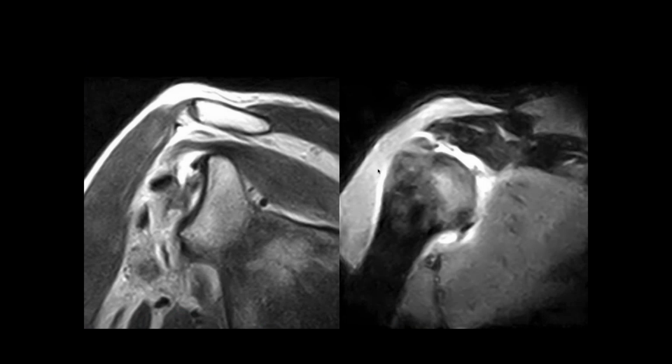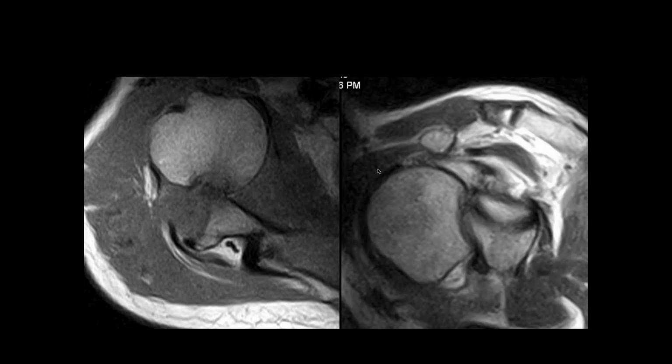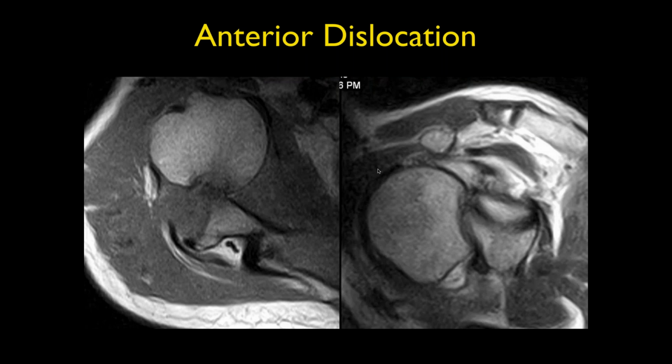On the image on the left, I don't see the humeral head. On the image on the right, I guess we moved anteriorly, and then we do see the humeral head, so it's anteriorly dislocated. Okay. And yeah, it's acted on the anterior glenoid. Okay, so this is the acute Hill-Sachs impaction and the typical mechanism. This is an anterior dislocation.